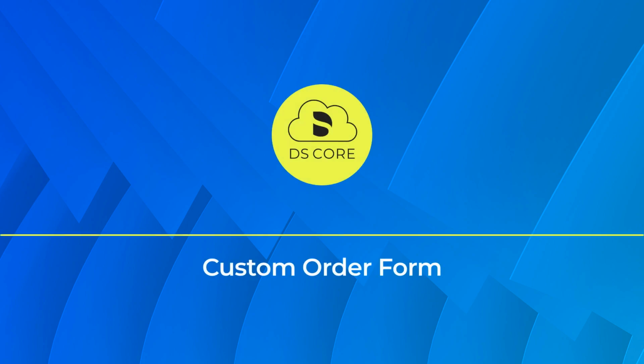The following tutorial describes the new custom order form to submit orders to your lab. Let's begin.